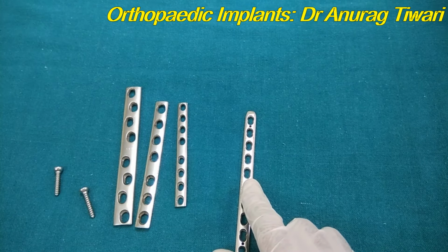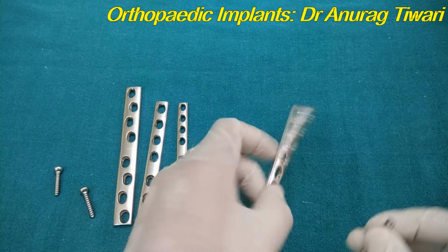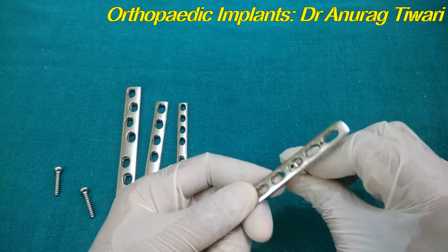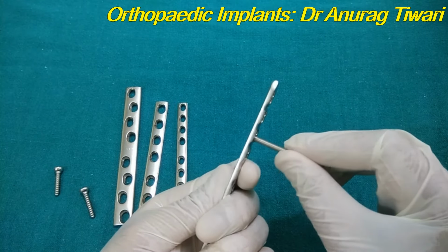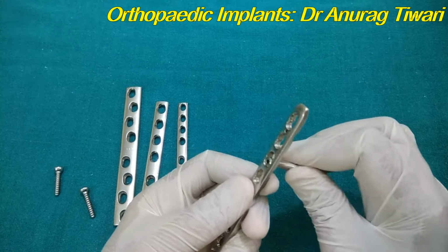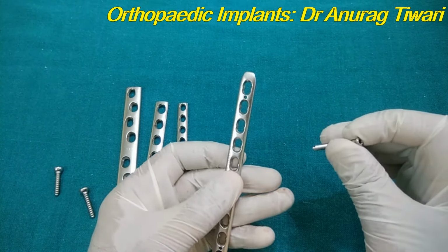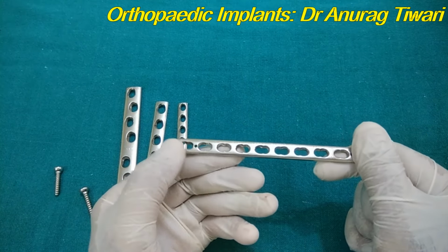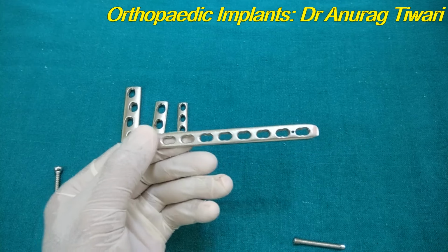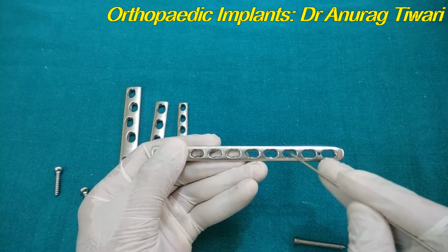The locking plate basically has the mechanism of locking the plate with screws. So when you tighten the screw, it gets locked. The screw cannot move. So it gives better stability, better fixation, better purchase of the implant. So basically this is actually a combi hole plate. This is not exactly the pure locking type of plate. It has both the holes. It is an 8-shaped hole. You can see that it is an 8-shaped hole.